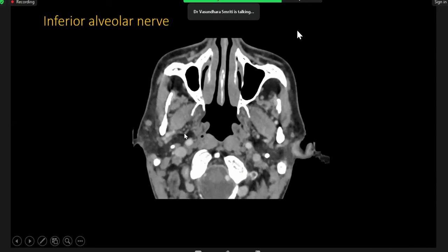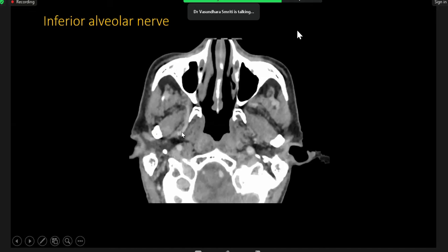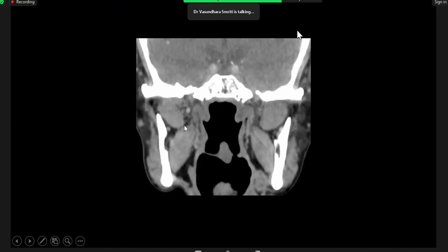Now, what happens over here? Over here, you have started seeing lots of dots. The pterygoid plexus comes over here. If you feel you are not able to identify the nerves over here, it actually becomes difficult. You may ask for an MR at that level. Once it reaches the parapharyngeal space, it normally travels straight, and if you keep your pointer like this, you will enter the foramen ovale over here.